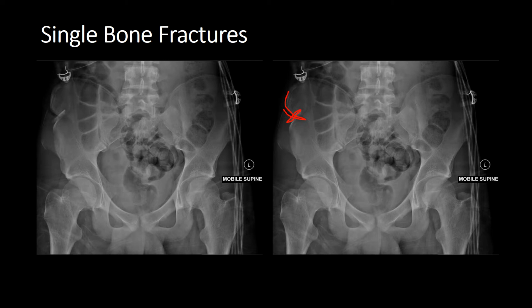So remember, when you're looking at a pelvis, because it's very complicated, you have to have a good search strategy. You want to scrutinise the main pelvic ring, both the inner and outer contours. With the inner contours, you want to be looking at the iliopectineal line, the ilioischial line, and check your obturator foramina.